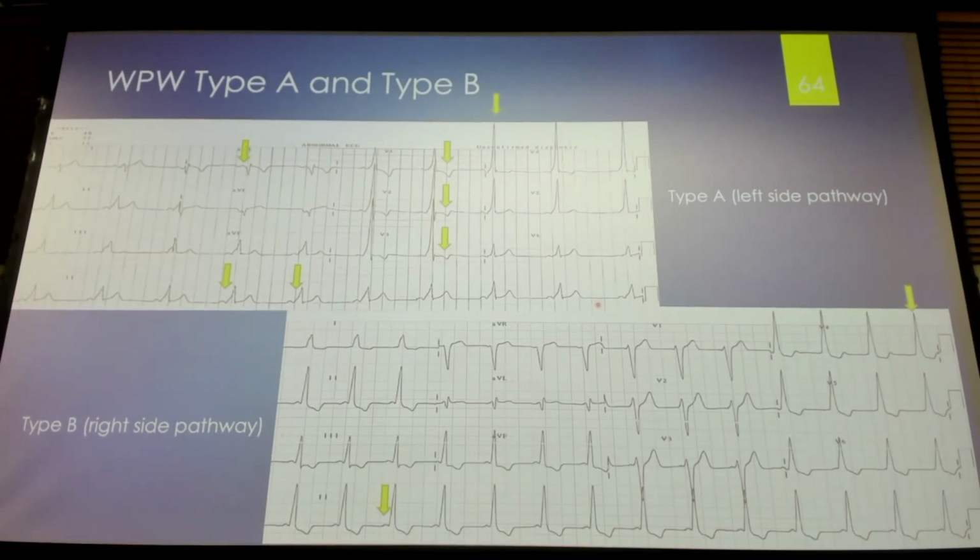Okay? So short PR, wide QRS, and then we've got this change here in our V1 through V3, where here it looks pretty normal. We've got our tall R waves over here. Okay? And then look at our T wave inversions, they're going to be on our other leads, our 4, 5, and 6, versus our 1, 2, and 3. And that's really your big difference, is those R waves are more prominent in V1, V2, V3 than they should be. So that's the first thing you look at.